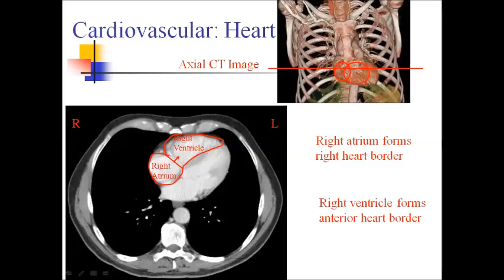CT provides more detail about heart position and structure and allows us to visualize the localization of different heart chambers in the chest cavity.